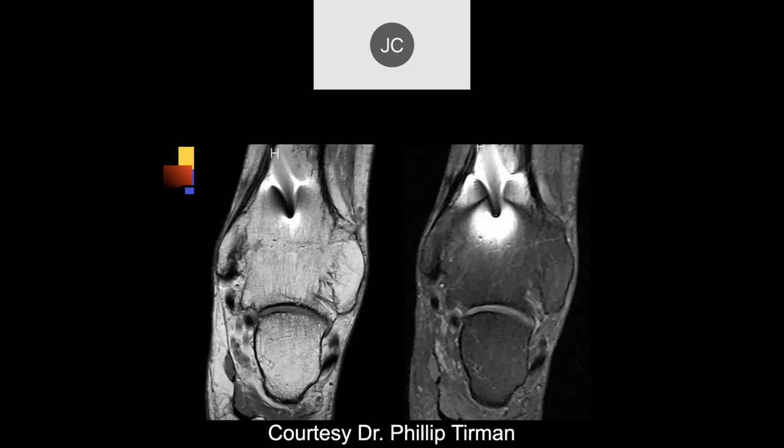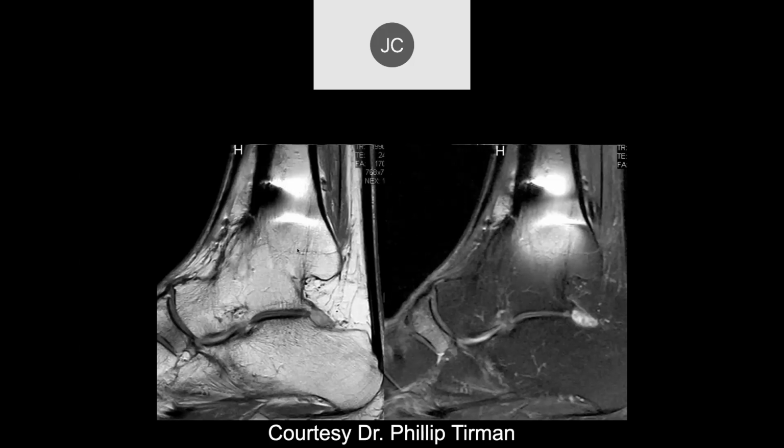All right, so looks like there's complete bone fusion between the talus and the tibia and some susceptibility artifact more proximally. And it looks like we have a little bit of malalignment here between the distal tibia and the talus. This is a tibio-talar fusion. I think somebody did surgery on this patient and they didn't put it in quite the right position. And then we also have stress changes to that navicular bone as well.